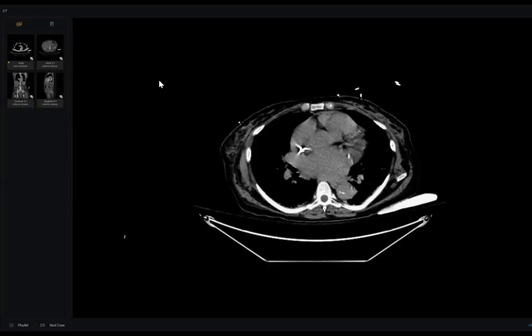the descending thoracic aorta, which may indicate that there is mural thrombus, which is causing some displacement of the calcific intima. However, I will see post-contrast images to see any perforation or any ulcerated plaque for further evaluation, because it is likely representing, or it may represent, acute aortic syndrome, Stanford type B. But I would like to see the whole post-contrast study for it.